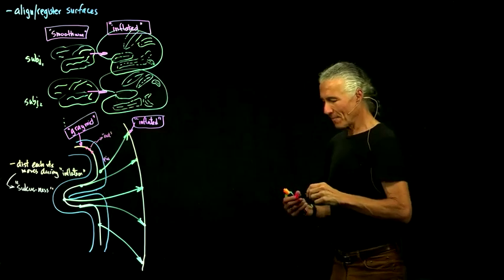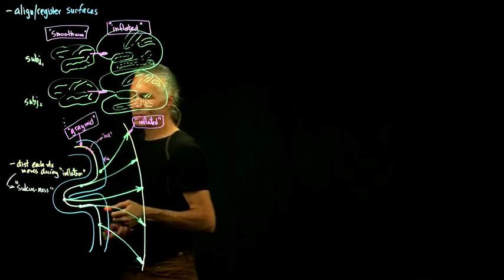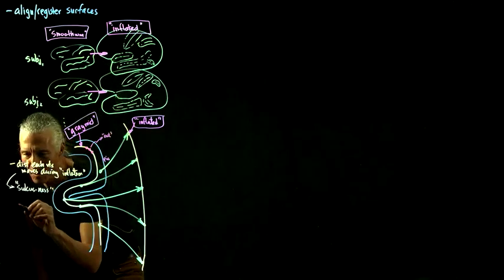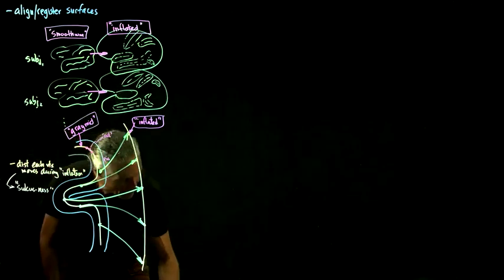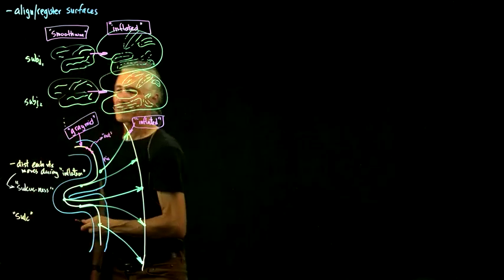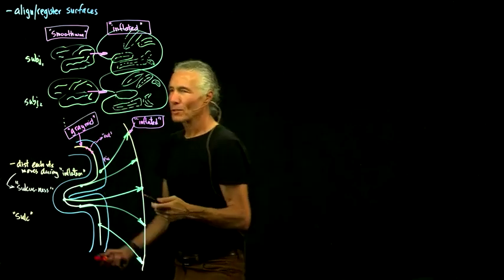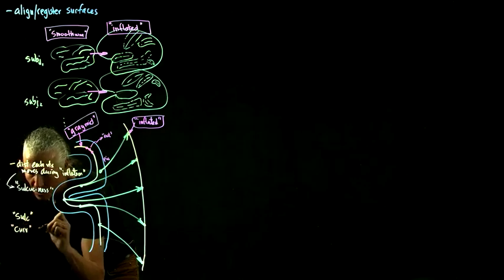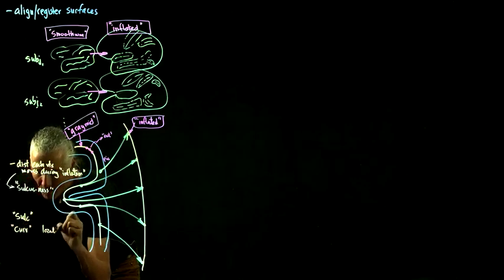That measure is called curve in FreeSurfer. This one is sulc, and that's this distance. Curve is very local, and this one is a sum of movement.